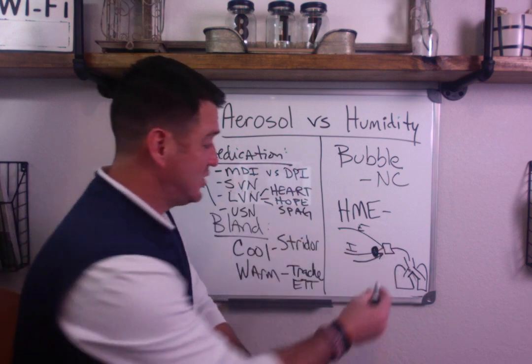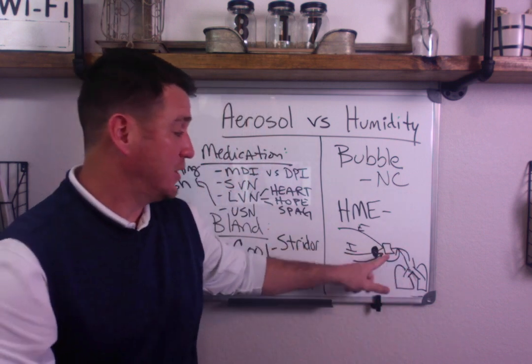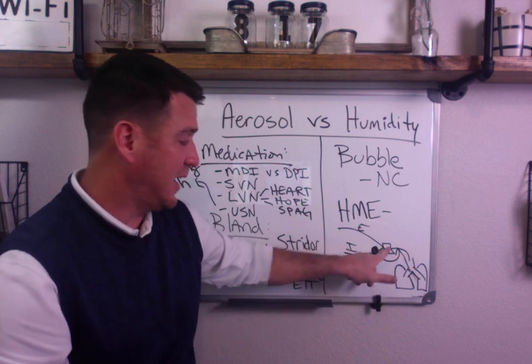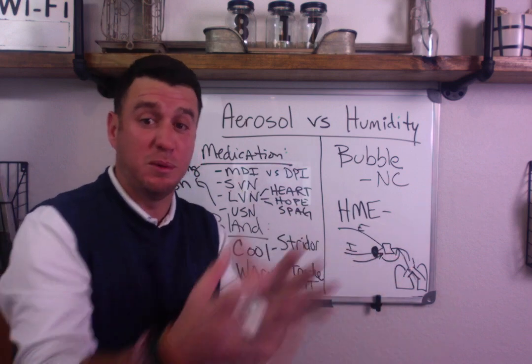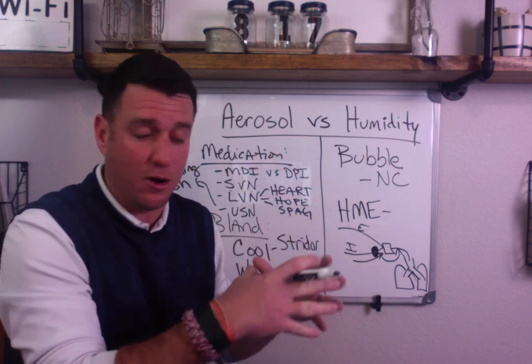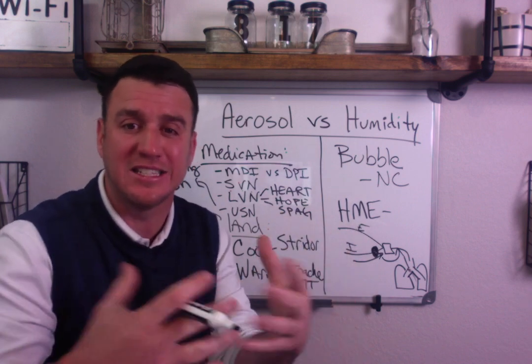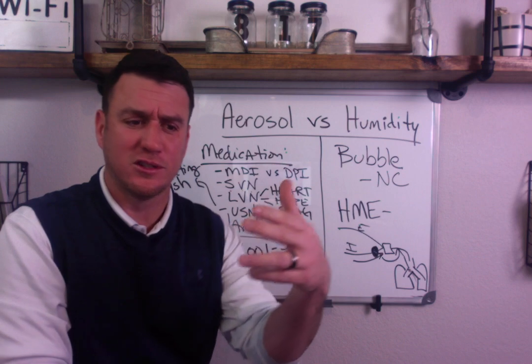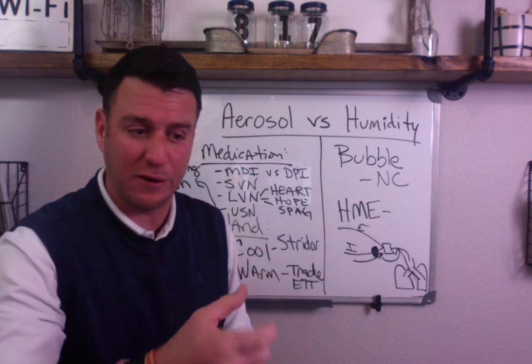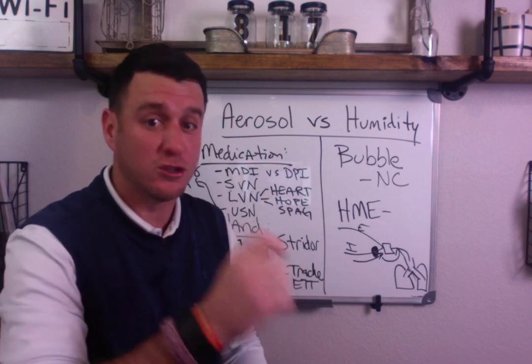The better option is to put the SVN or the aerosolized medication distal to the HME. Because if it's proximal, if it's before the HME, then all of that gas is going to be trapped. All of that aerosol, that drug aerosol, is going to be trapped in the HME, and it's never going to reach your patient. Now, there's a few marketed HMEs where you can switch it. You can turn it from HME to aerosol status, and that's great. Just be sure to switch it.